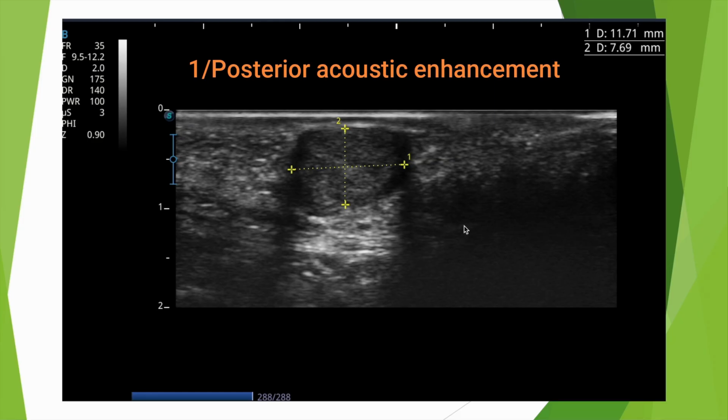So why do I talk about this so much in my courses, especially the introductory ones? Because it's important to understand what we're doing if we don't want to make false diagnoses. And that's really the issue with ultrasound. When your ultrasound waves pass through fluid, they're not attenuated. They're not slowed down. So as a result, they arrive with more power at the back of this image, and so they're going to cause an artifact. We call this posterior enhancement.